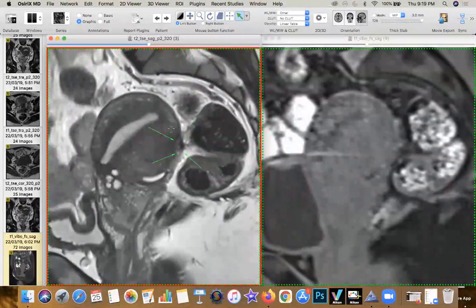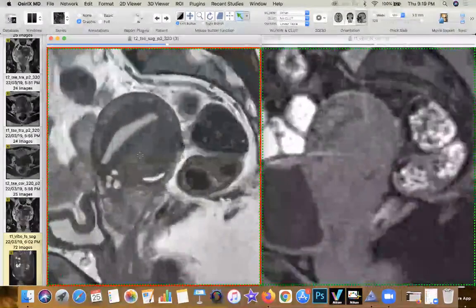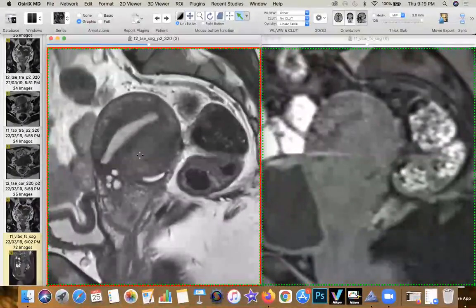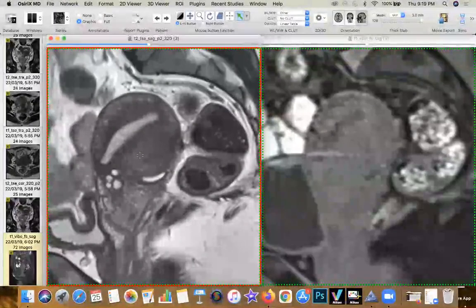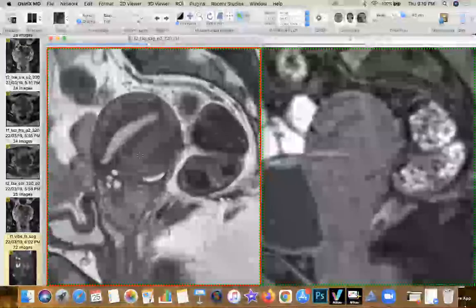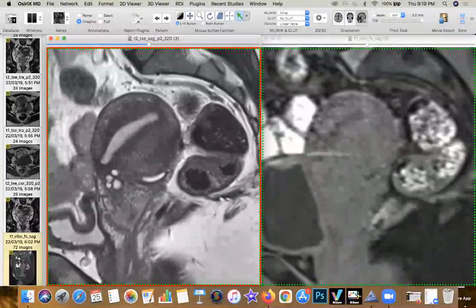So yesterday I had shown you all the terminology of adenomyosis, which is either focal or diffuse broadening of the junctional zone. And isolated junctional zone thickening is a very complex topic. There's no definitive way to differentiate that from a pre-adenomyotic patch, especially in the reproductive age group. The variations in the junctional zone can be as much as 2 millimeters to 20 millimeters. So if there is focality, contour bulge, or deformity, yes, you know that this is highly likely.